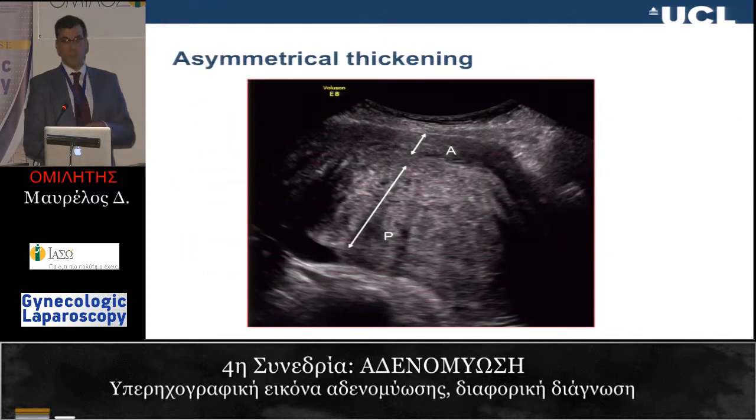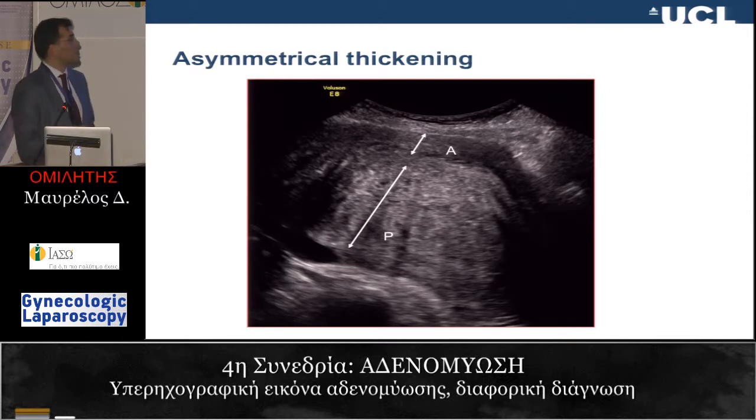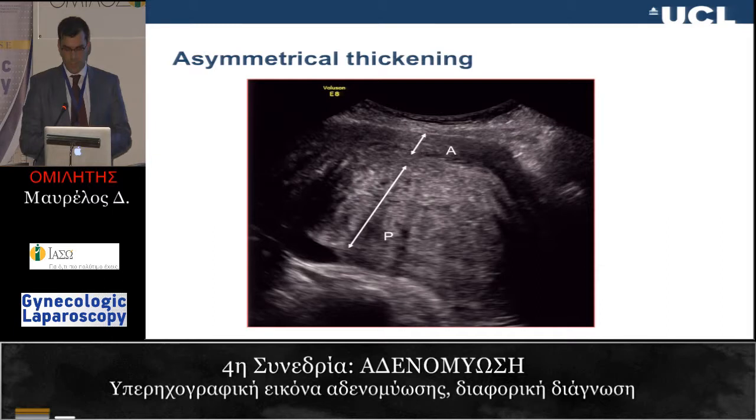Again, this is a woman who came to see us for fertility. She was one of the HCAs, one of the nurses that help us in theater, and she was 40 years old, and she had this uterus, and she wanted to get pregnant. So we had a discussion about that. We did her ovarian reserve testing, which was poor because she had endometriosis alongside that. She had a uterus that, as you can see on this transabdominal scan, was reaching the umbilicus, and unfortunately she had a hysterectomy not long after the initial presentation.